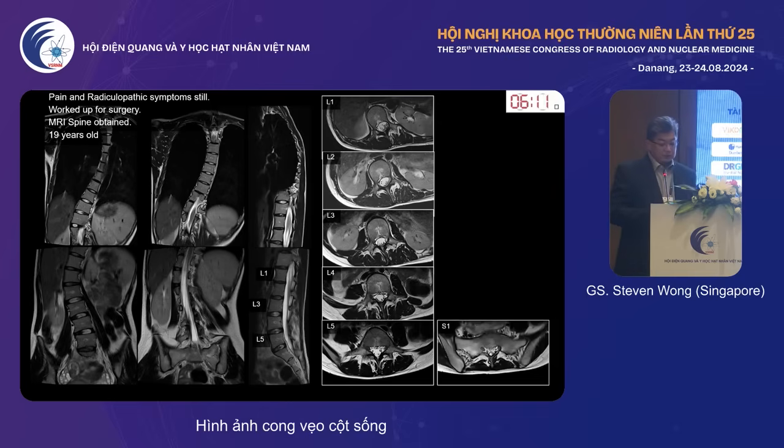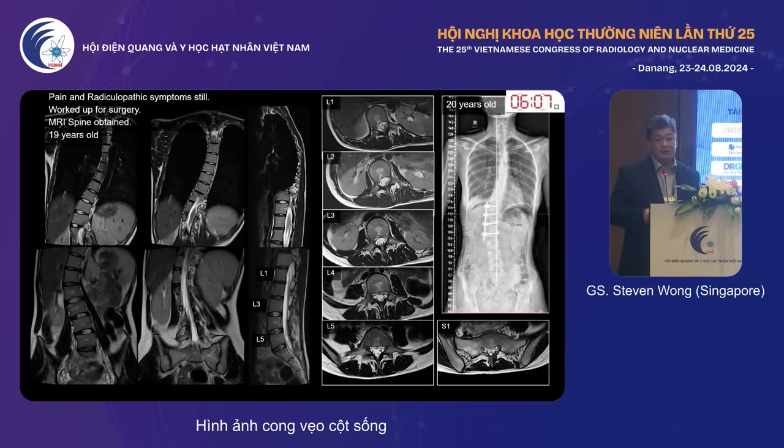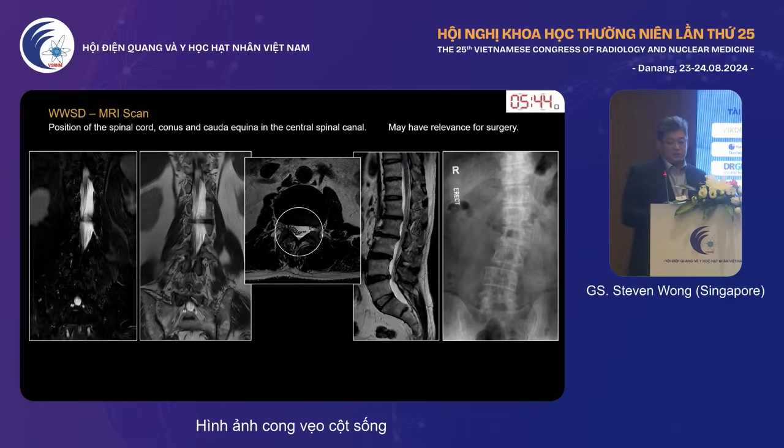So you unfortunately will need to do an MR or CT and then assess the degree of rotation and also the alteration in the angle of the vertebral body in the coronal plane as well, because that will affect how big the neural foramen is on the concave side versus the convex side, and whether there are any disc problems at that level. So this patient eventually had spinal stabilization, right?